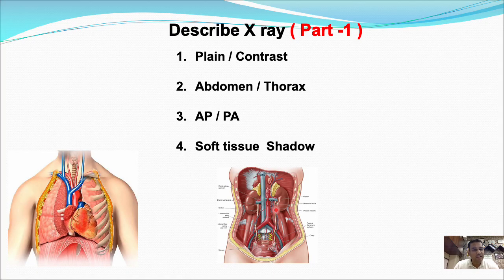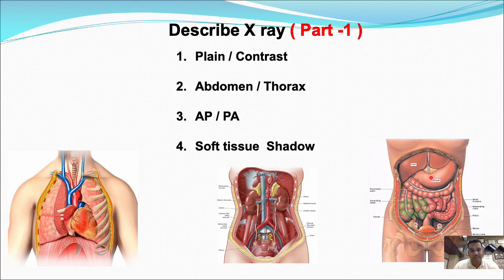In gross, when you're given an X-ray of the abdomen also, you should remember this. And third is this. This is the intra-abdominal structures. This is the liver. This is the right lobe of the liver on the right upper abdomen. This is the left lobe of the liver. Then you have the stomach.